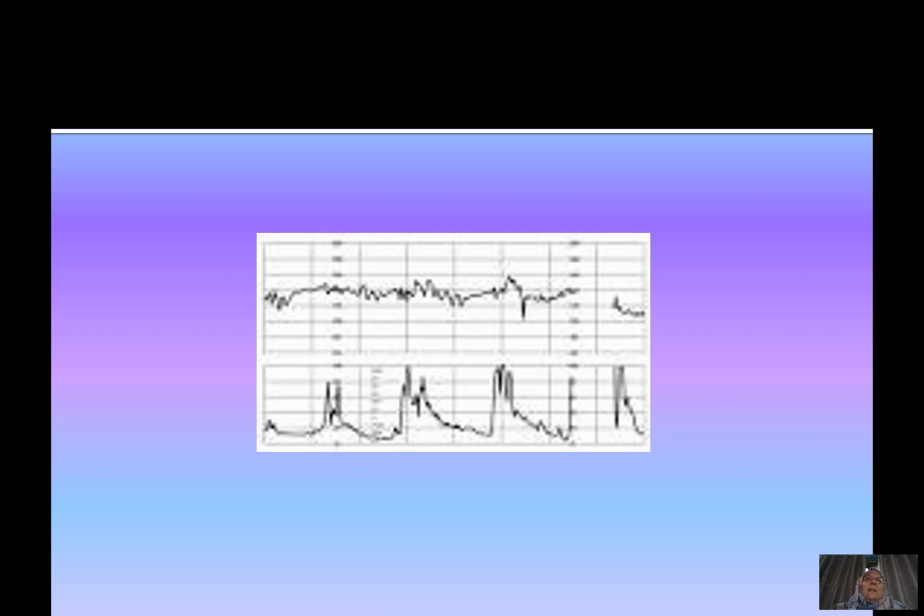If we look at the fetal parameters, again we cannot read the baseline rate, but it is on the right line, so the baseline rate is normal. You can see no proper deceleration, and there's no proper acceleration either. Maybe a small acceleration at the beginning of the 6th square that you see. There's a small acceleration there, but the little peak down is not a deceleration, as it's not long enough to be a proper deceleration.